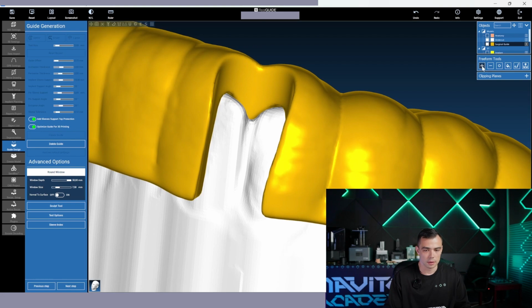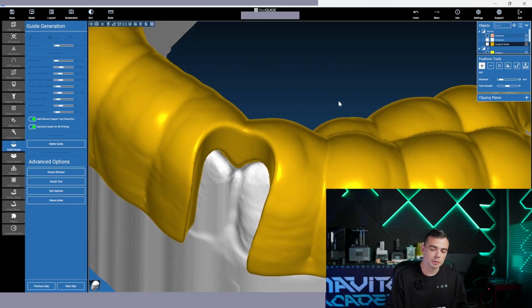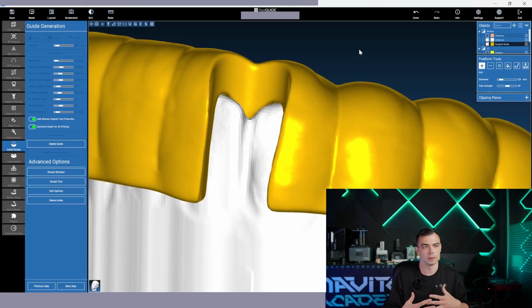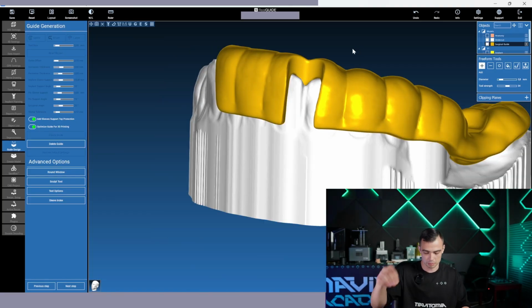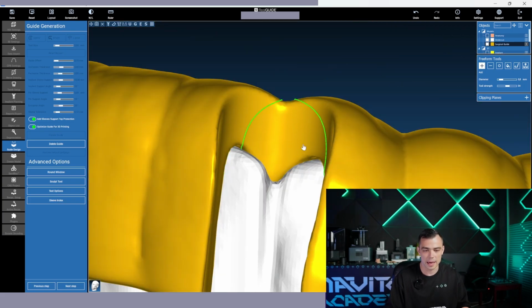And here you can see an M shape of the window. It's quite informative, because you do not need to use mirrors, or bend your neck like this during the operation. You just press the guide and take a closer look at this M shape.